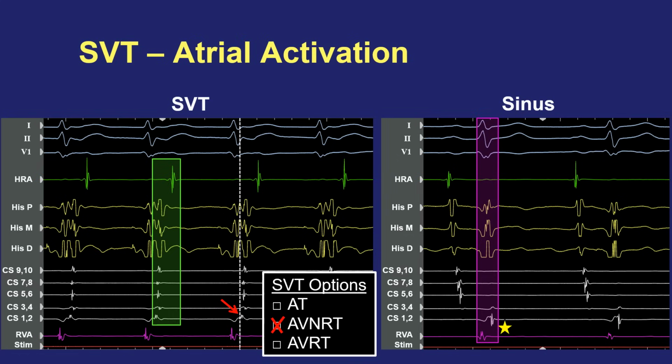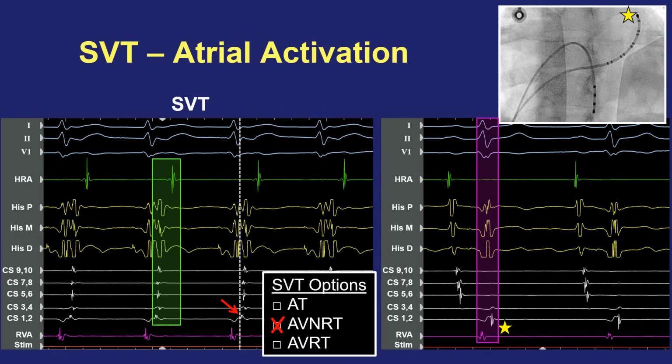Well, remember that the coronary sinus runs in the AV groove between the left ventricle and the left atrium, but as you get further away from the septum, it does tend to veer away from that groove and more over ventricular tissue. Also, you can potentially place a coronary sinus catheter inadvertently down one of the vein branches overlying ventricular tissue. And if you went back in this patient when catheters were first being placed and look at where the coronary sinus catheter was located, it was actually advanced very far in so that the tip of the catheter was overlying ventricular tissue, which explains why this sharp electrogram here is ventricular, not atrial.